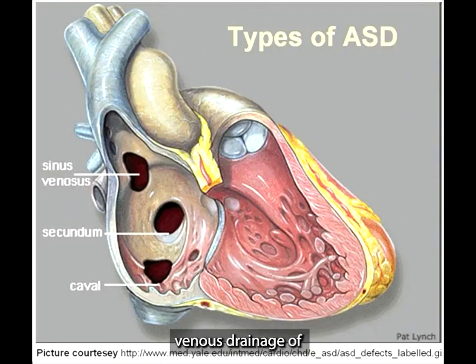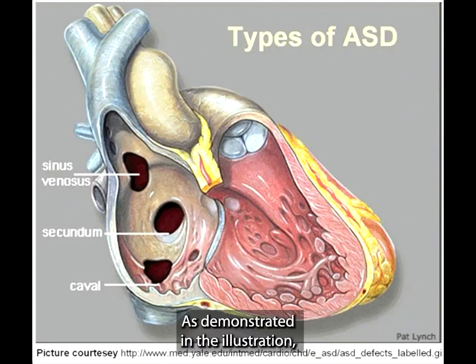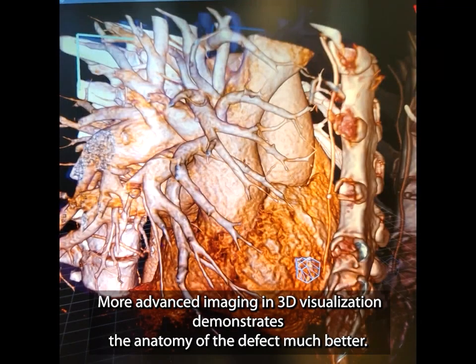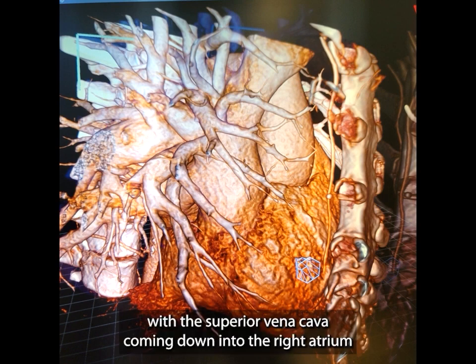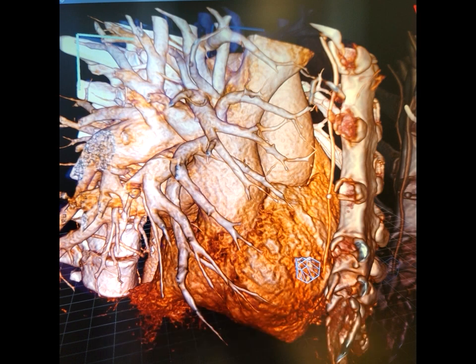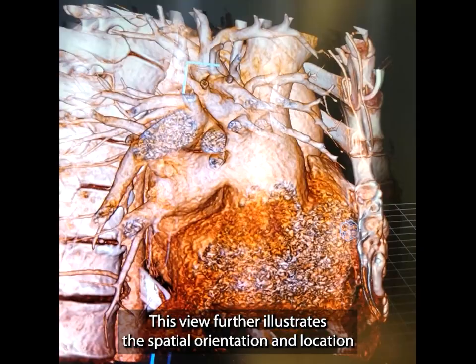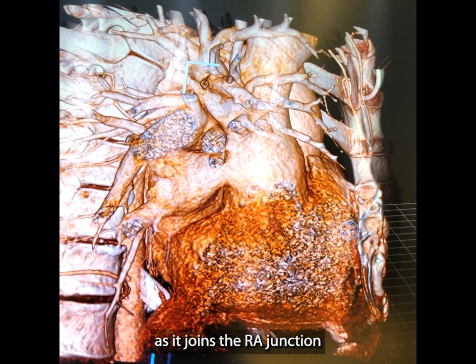anomalous pulmonary venous drainage of two or more pulmonary veins, commonly arising from the right side of the heart, as demonstrated in the illustration. More advanced imaging and 3D visualization demonstrates the anatomy of the defect much better. Here you can see the sternum and the right heart closely related to it, with the superior vena cava coming down into the right atrium and pulmonary veins attached to the lower end of the superior vena cava. This view further illustrates the spatial orientation and location of the pulmonary veins into the different aspects of the SVC as it joins the RA junction.